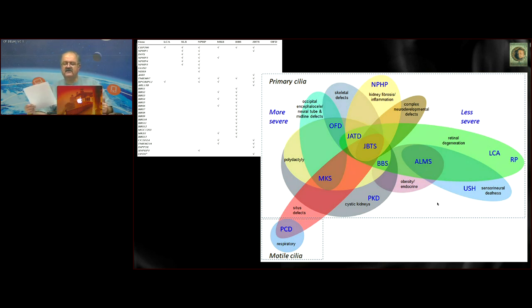In fact, when you find kidney disease with polyhydramnios, there are two differential diagnoses. First, you see whether there's a left kidney, because sometimes a dilated left kidney can actually be sitting on top of the gastroesophageal junction and interfering with swallowed fluid passing into the fetal stomach. And therefore you find polyhydramnios. And then if you find a bad looking kidney with polyhydramnios, then again you start thinking in terms of Bartter's, because that's truly what it is, that these kidneys don't really have a structural disorder in that sense. They have a tubular disorder or a nephronic disorder, as we like to call it, and there is polyuria and therefore polyhydramnios.